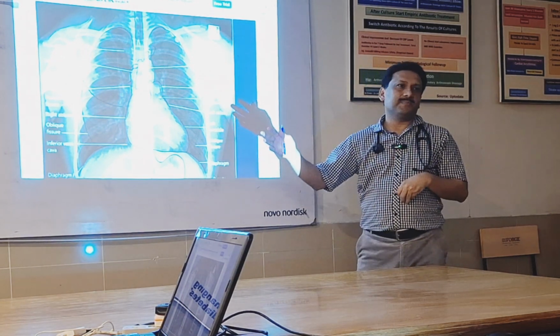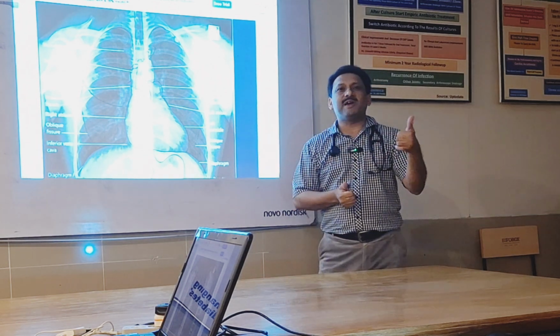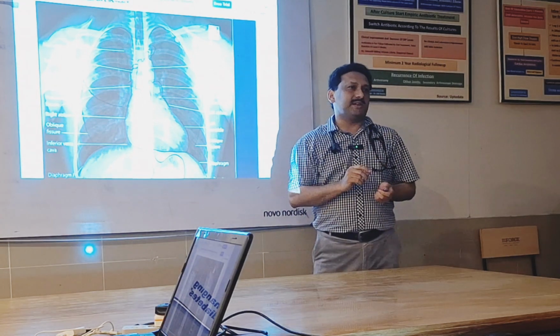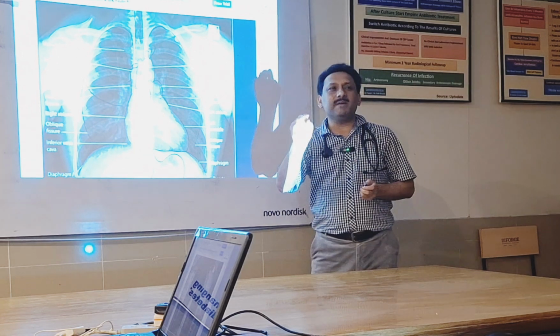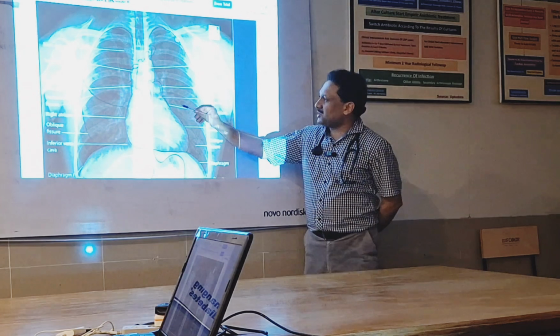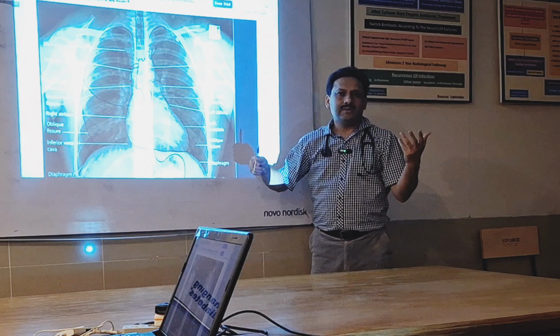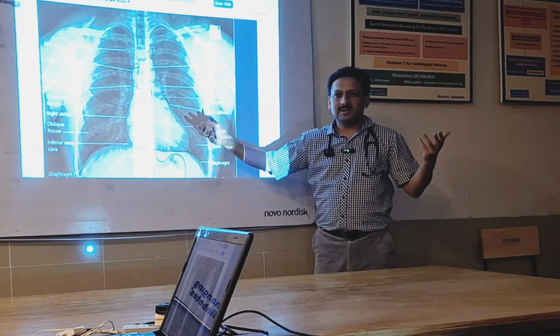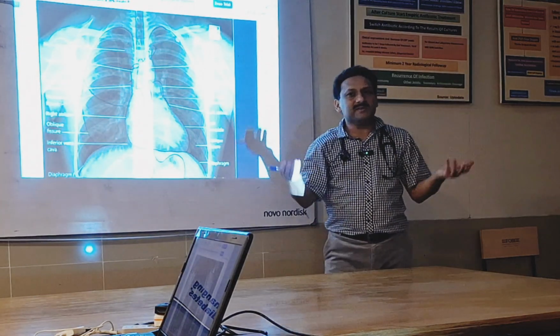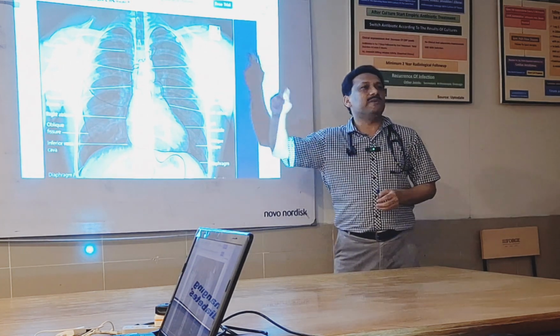The third thing is then exposure. Whether the X-ray is underexposed or overexposed, what will happen then? Overexposed X-ray. The things are now very much black. If things are very much black, what will happen? There was an opacity here, a whitish opacity here. That was due to some disease process. That was a coin lesion. That was some metastasis due to malignancy. If we make things too black, what will happen? That opacity might not be visible altogether. So remember, you may miss an opacity if the X-ray is overexposed.